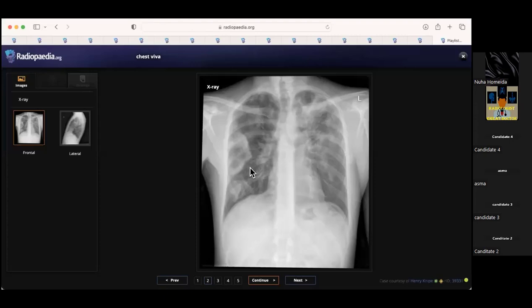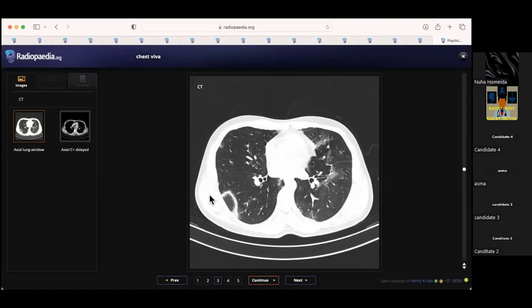Yes, I am thinking, generally speaking, other than the occupational disease, about a metastatic process. It could present like this, and also in cases of mediastinal mass lesions, such as malignant thymoma, it can be presented like this. Okay, so that's the CT.